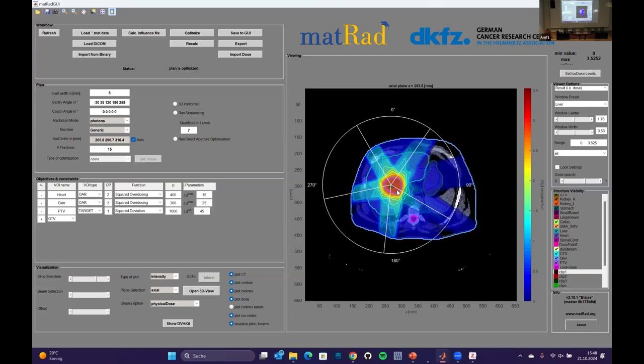Another annoying thing that we do not touch today is that it is moving. The heart is not something that you can control during the treatment. With breathing, you can tell the patient, breathe in, hold your breath, beam on, and the beam turns off with tumor tracking when the tumor goes out of the window. But for a heart which is constantly beating, you cannot ask the patient, please control your heart. A little bit difficult.